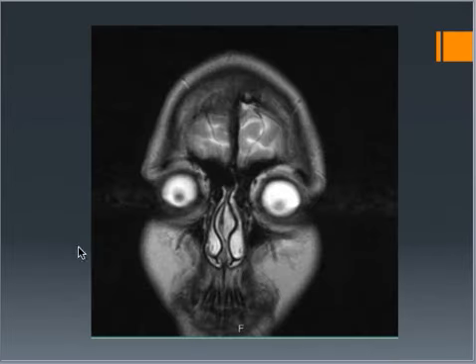This is just kind of a funny picture. This is actually a frontal view of the face. So you can see the eyes here, the brain, the mouth, and then the sinuses in the nasal cavity. It just kind of is a creepy looking image a little bit.